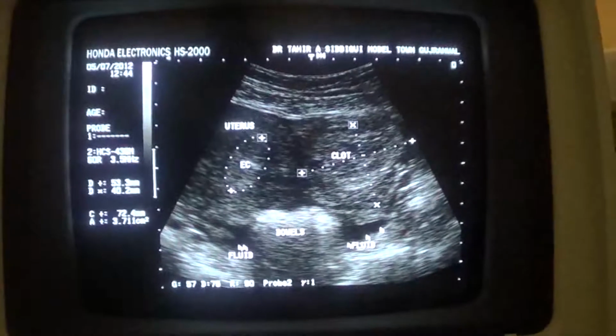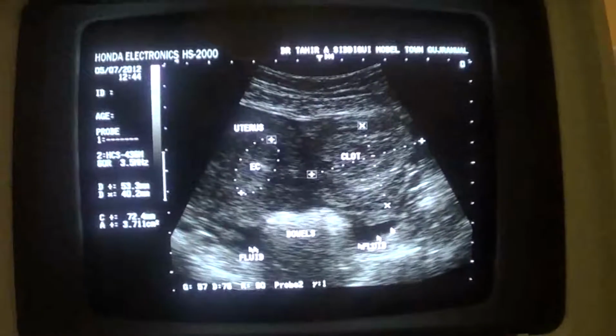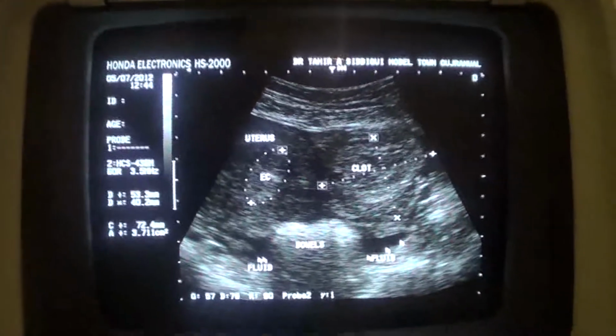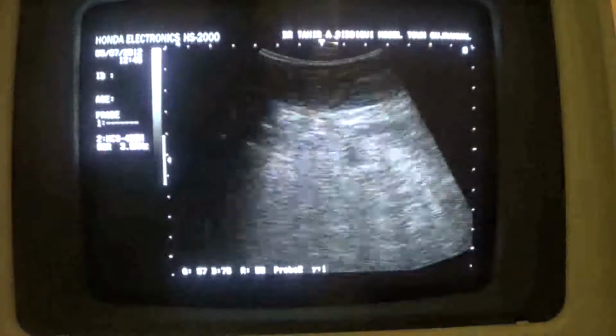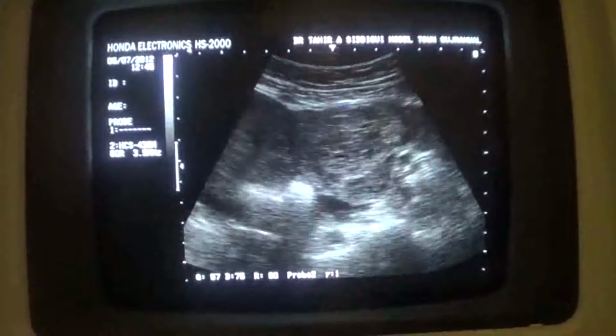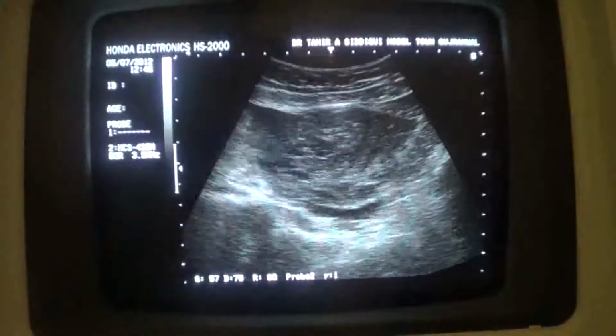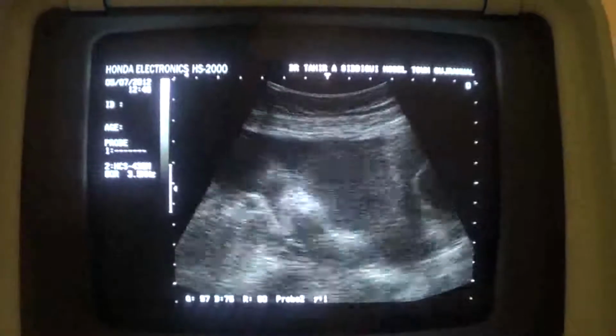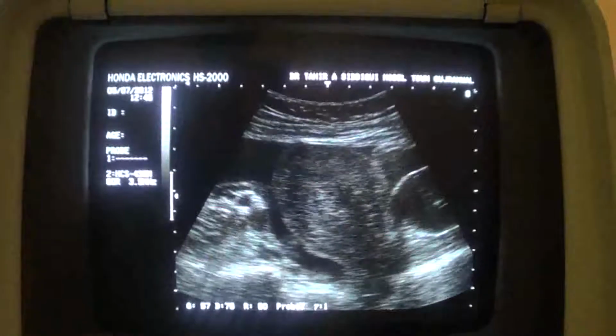So this is in fact, to my understanding, without any clinical notes or lab, only the verbal history that I informed you was available. With that verbal history, my conclusion will be that this is a ruptured ectopic pregnancy because the uterine outline is intact.